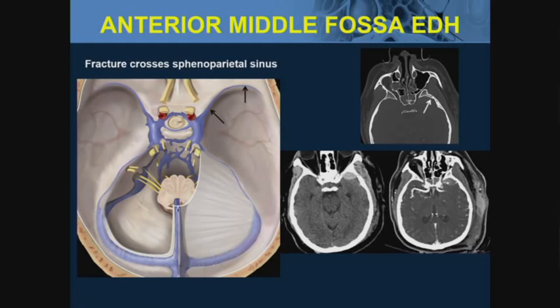For whatever reason, the surgeons in this case got spooked and they ordered a CTA, which we did, and we actually saw a little spot sign. They got all nervous and we said, don't worry, it's not going to get any bigger. This is anatomically limited. We followed it up 24 hours later, and indeed, it hadn't. Yes, it had a spot sign, but in this case, it's so anatomically limited, it's not going to get any bigger.